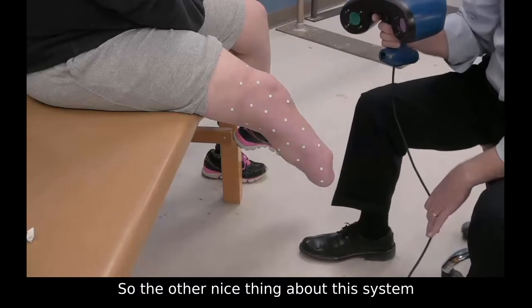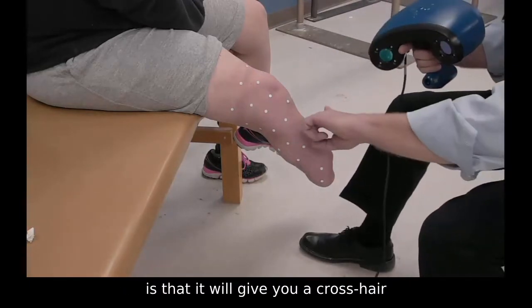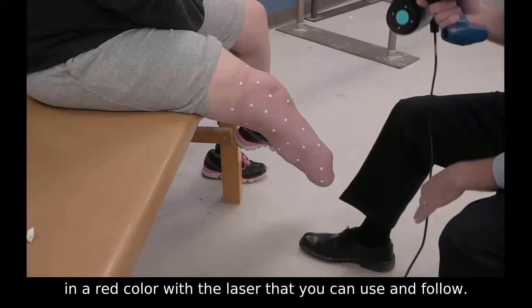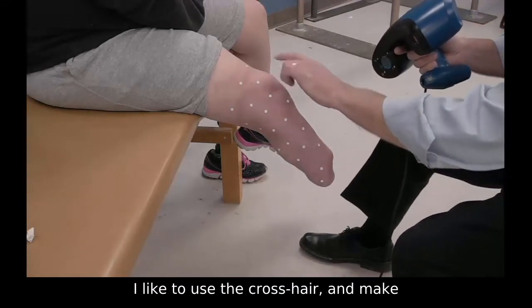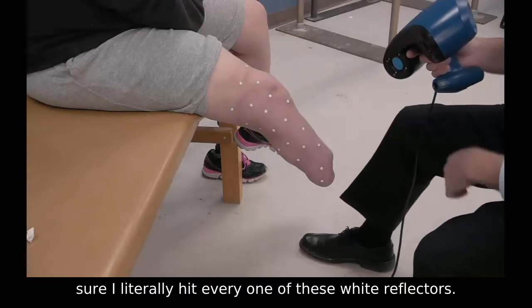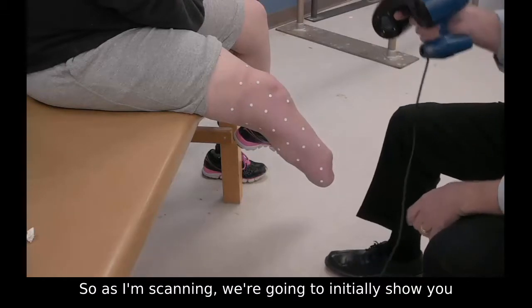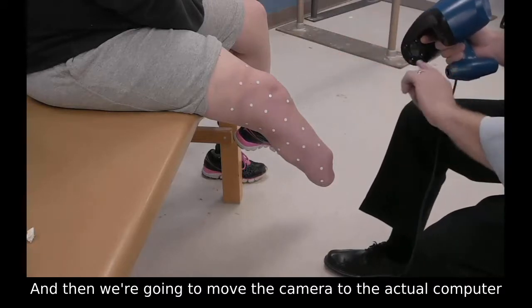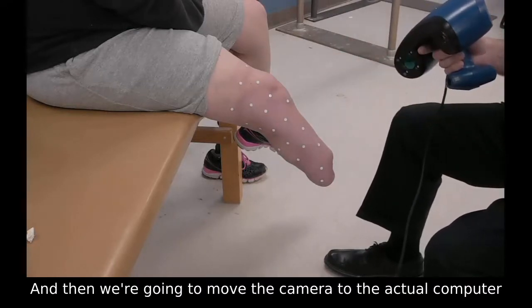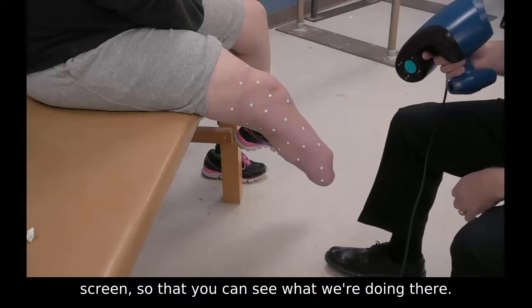So the other nice thing about this system is it will give you a crosshair in a red color with the laser that you can use and follow. I like to use the crosshair and make sure I literally hit every one of these white reflectors. So as I'm scanning, we're going to initially show you the scanning process, and then we're going to move the camera to the actual computer screen so that you can see what we're doing there.